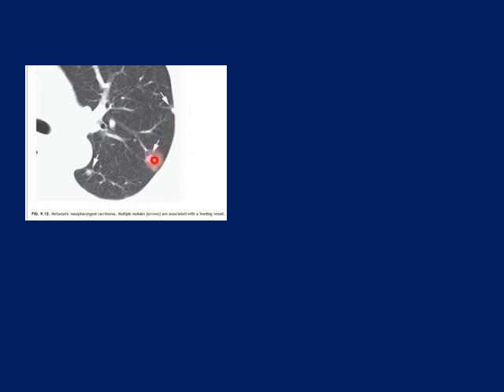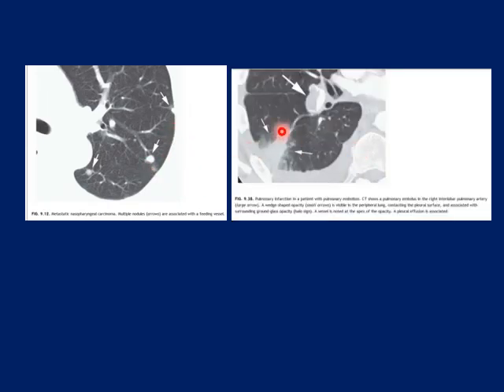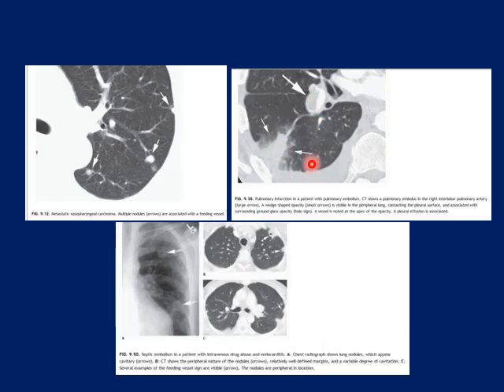Okay, these are metastases. Again, this is an infarction, triangular in shape, and this is the feeding artery, and as you see here, there is pulmonary infarction. Again, these are septic emboli. Okay, the idea is that either the malignant cells or the infection or the infected emboli go through the artery or arteriole until it blockades and makes either metastasis or infarction or septic emboli or septic infarction as in this.